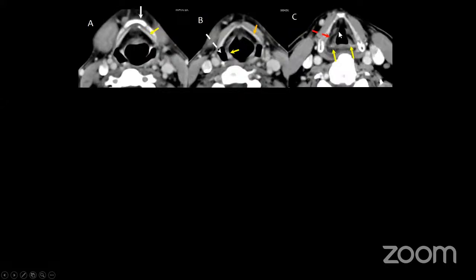The hyoid and the thyroid cartilage have a thyrohyoid membrane and a small structure, seen very well on sagittal reconstructions, that is the hyoepiglottic ligament. The space between the two forms is the preepiglottic space. The preepiglottic space continues along the fixed edge of the epiglottis and goes down into the paraglottic space. So there's communication between the preepiglottic space and the paraglottic space.